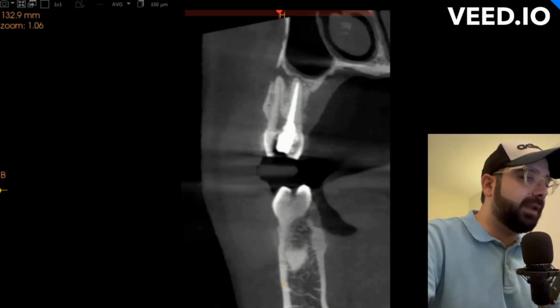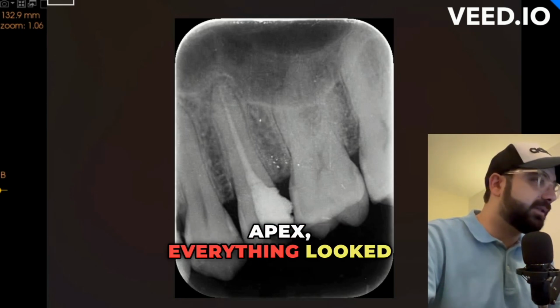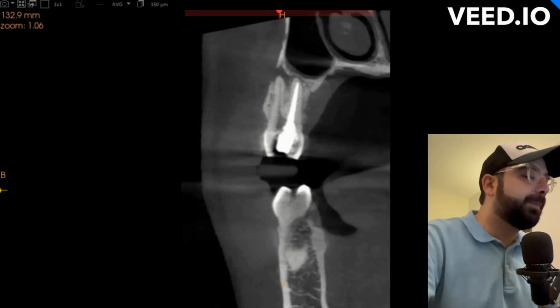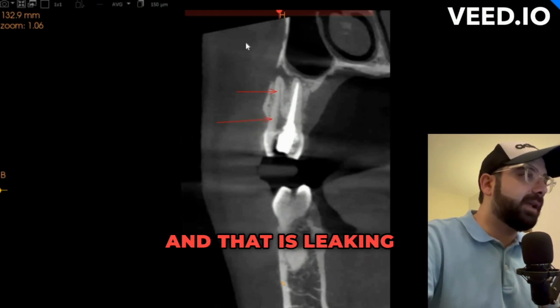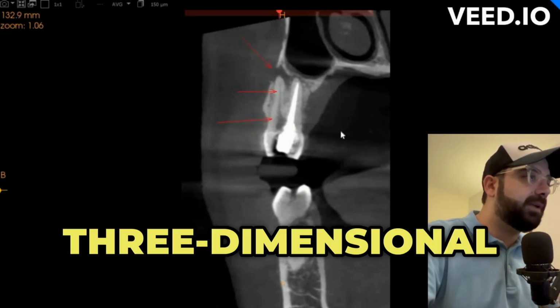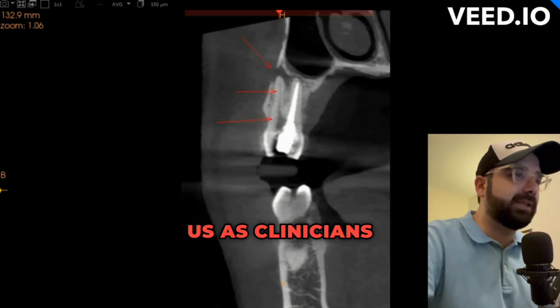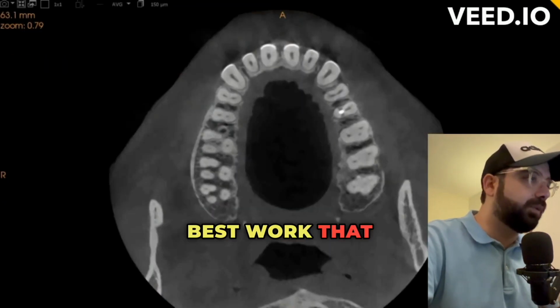So when we looked at the periapical, we saw that the obturation was almost at the apex, everything looked okay. But as soon as we moved to the three-dimensional image, the previous doctor actually missed out on the buccal canal. There's absolutely no instrumentation, nothing there. And that is leaking into the bone right here, causing inflammation, pain, and problems to the patient. So this is how three-dimensional imaging absolutely makes things so much more clear for us as clinicians, and makes sure that we give our patients the best work that we can.